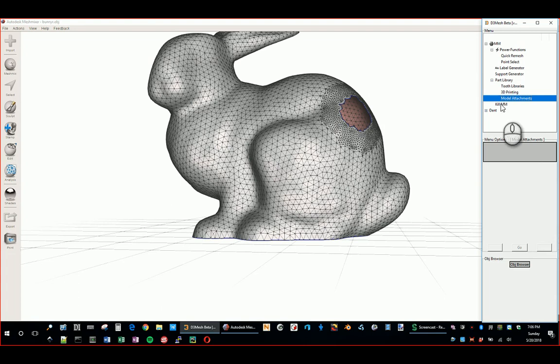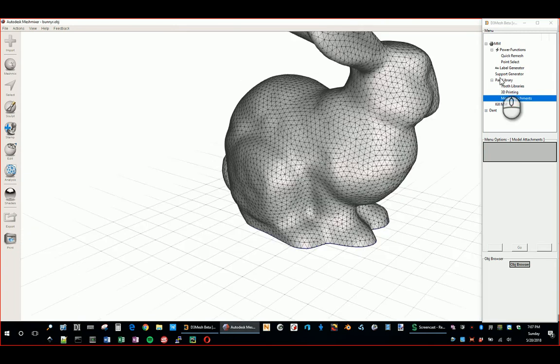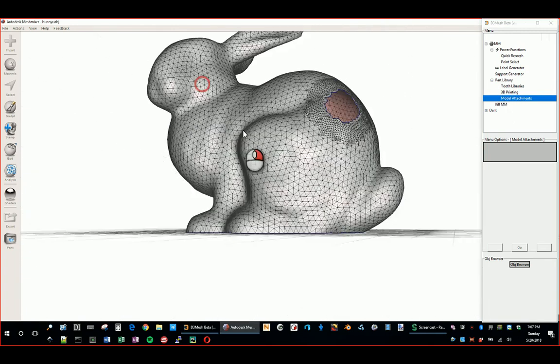if you're someone that uses Mesh Mixer often, you'll realize that from time to time you'll get into a situation where it just freezes up on you, and maybe you realize what you did, maybe you don't, but it just freezes up on you. And there's a lot of ways to get rid of that. You can try to just hack on the X button a little bit, and hopefully that'll get rid of it. Or you can use the task manager, but that's, again, more steps. So I just thought, heck, why not? I'm just going to include this in here.